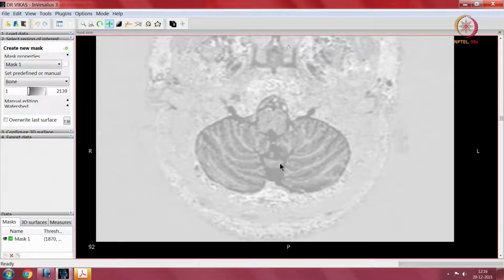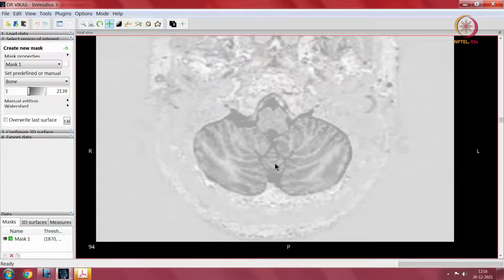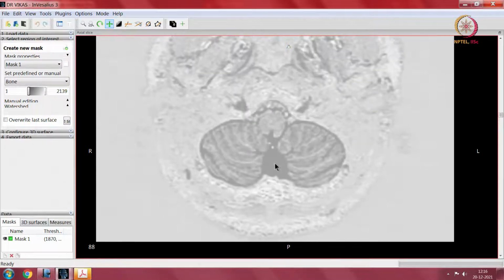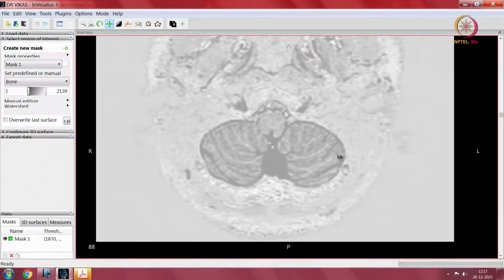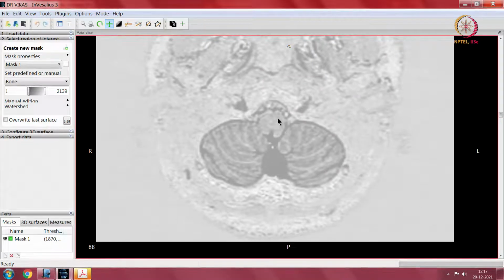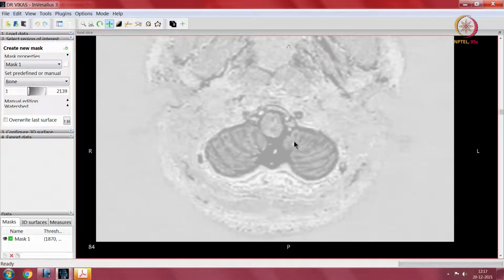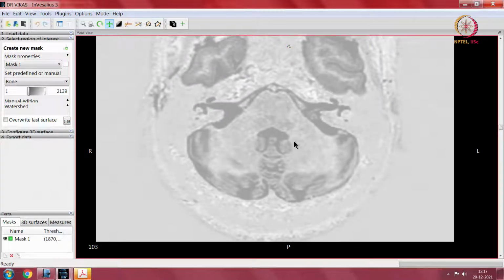So, these are things which I showed in my 3D anatomy class. So, the same things in 2D, how they look. So, this is uvula, then these things down, these bulges here are the tonsil. This is cerebellar hemisphere, this is the left cerebellar hemisphere, this is the right cerebellar hemisphere, it is by convention. And this round structure over here is the brainstem. Not very obvious, which is one of the reasons I did not want to start teaching anatomy through sectional imaging. Sectional imaging is advanced imaging because you need to understand what is there in 3D before you actually interpret what is there in 2D.